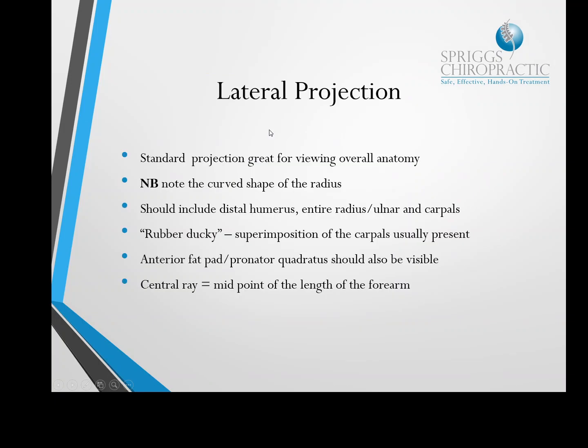So, lateral projection, again, standard view. You need to be taking both AP and laterals as a standard with most areas of anatomy to make sure that you're covering it in two planes. So it's great for evaluating the overall anatomy. There is a note here to notice the curved shape of the radius, which this view particularly appreciates. So it's very, very helpful.